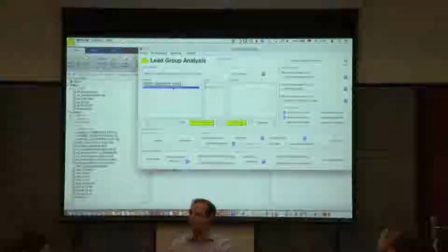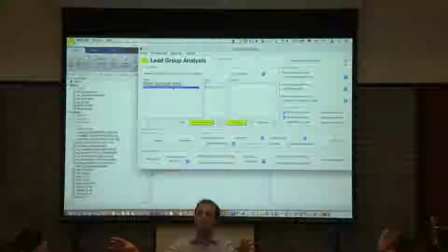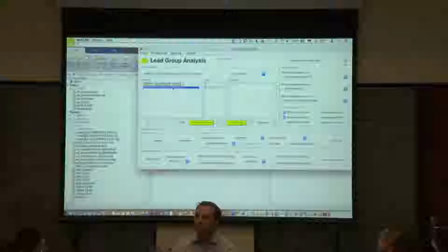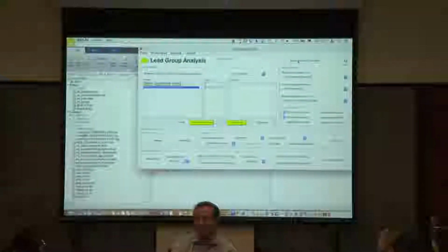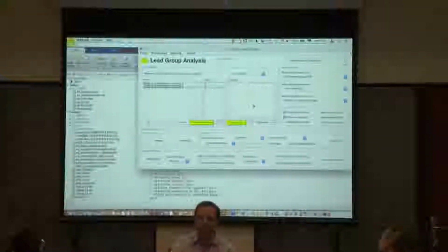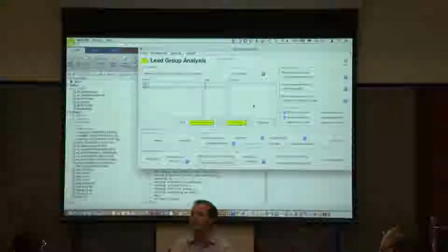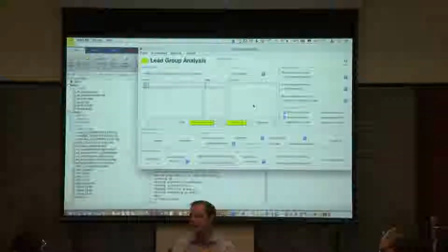Sometimes this can also be a problem. Sometimes you want the group analysis to be fixed and not change anymore. Maybe we have the same patients included into two group analyses, and we want one to be frozen and not change if we change the single patients, and there's a button for that up here. So we can say detach from single patient data, and then it asks you, are you sure? And if we are sure, then it's fixed now. So now this is independent and we can give it to colleagues and so on. So it's a portable file.